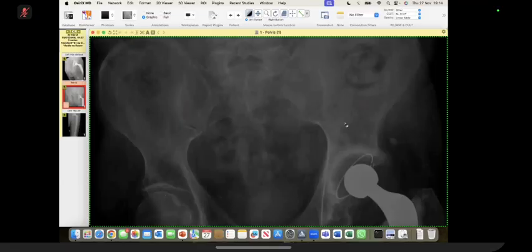Yes, sir. I can see that there is a destructive lesion involving the left half of the sacrum, and it also has probably a soft tissue component involving the pelvis. I cannot see the normal arcuate lines. In this old age, I cannot see any calcification or any osteoid matrix.